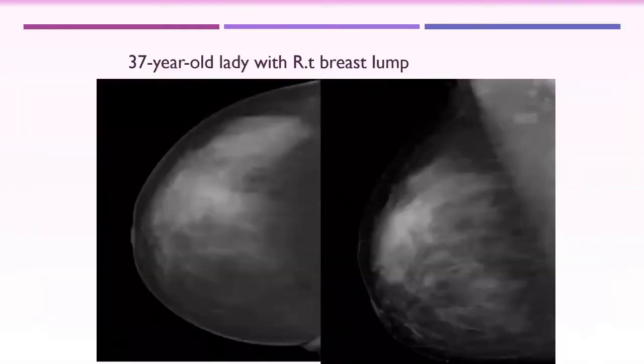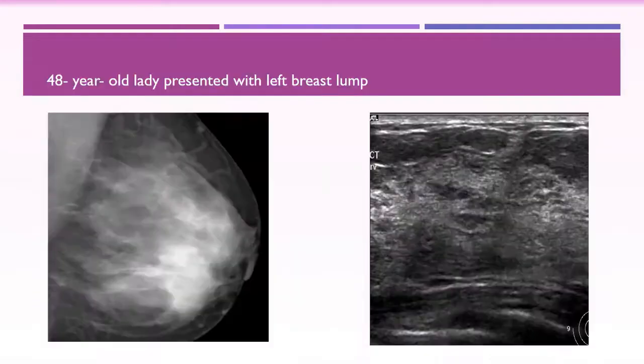There were small microcysts in the previous ultrasound — small cystic changes, micro cysts. Yes, but that doesn't explain the palpable abnormality. What explains the palpable abnormality is this one.